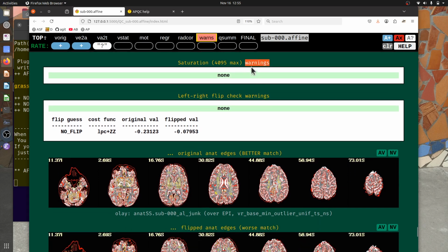Additionally, when you acquire data, you're mapping signal to numerical values, and because the computer types have a finite amount of space on the computer they'll take up, they also have a finite range of numbers that they can store those values in. And the kind of saturation that's being talked about here would be if your time series included values that reached the maximum number storable.